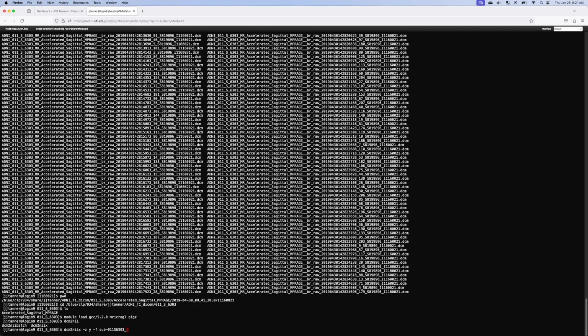And so with the BIDS convention, we like to have the session specified. And there are different ways to call the session. So it would be underscore ses, S-E-S, dash, and so you could have something like base or baseline or pre or post or whatever the naming convention is. There's flexibility there, but just for simplicity, I'm just going to call this session 1. Now, I don't know if that's true for this particular scan. Some of these participants from this study were scanned multiple times, but we'll just pretend session 1. And then underscore T1w.